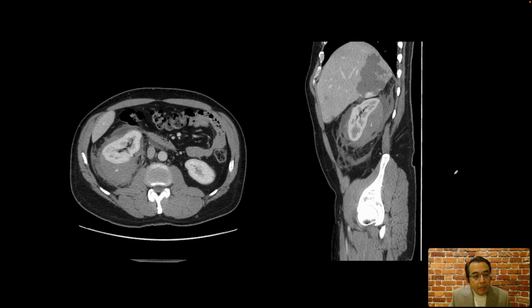This patient recently had a renal biopsy, and they presented with abdominal pain. CT scan shows that there is a large density abutting the right kidney. And here is the kidney, which looks like it's been pushed forwards in this direction because of this hematoma. And so they have a subcapsular hematoma with internal focus of contrast extravasation suggesting active bleeding.